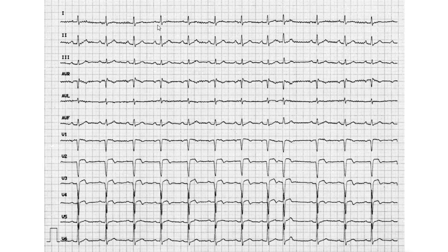It is based on the RR intervals. Are they all the same? Are they like the same? Is the RR interval the same, with a maximum tolerance of like 0.16? If it's beyond 0.16, then you say no, that's too much.